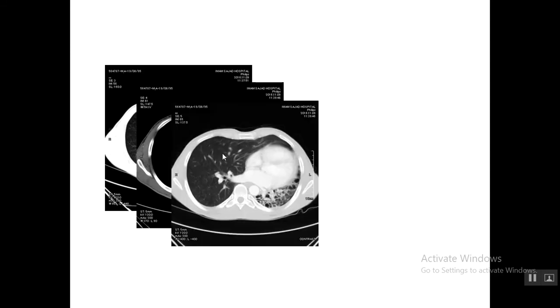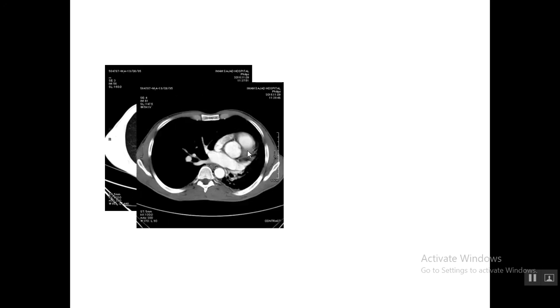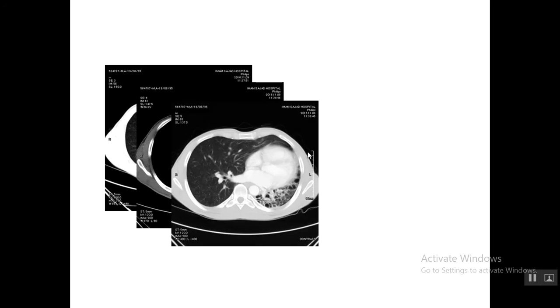In the other images here, you also notice cardiomediastinal shift to the left side and decreased lung volume, but the point of interest for me was the transmidline crossing, the migration of right lung parenchyma through to the left side. Also, it has extended to the anterolateral aspect of the cardiomediastinal structures, and in other cuts, you can see this finding too.